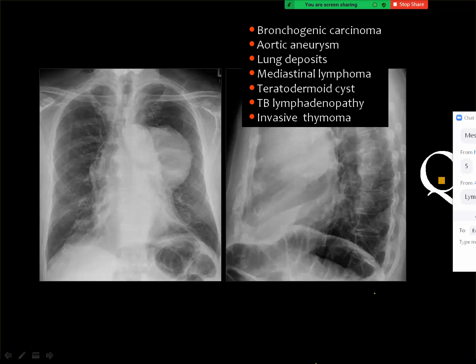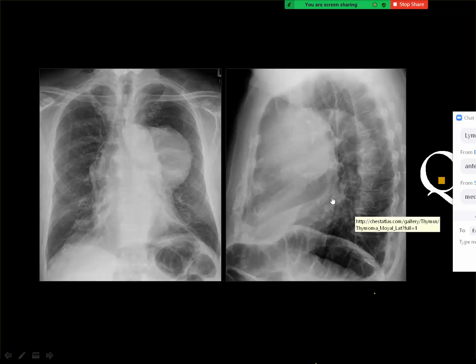Yeah. Also, the possibility of lymphoma maybe, but I encourage you to diagnose bronchogenic carcinoma, which is the common pulmonary lesion. But if you feel that this lesion is not a lung pathology, and Sarah is putting some of the right answer, that this is not a lung mass, it's a mediastinal mass, because in the lateral view it's projected anteriorly.